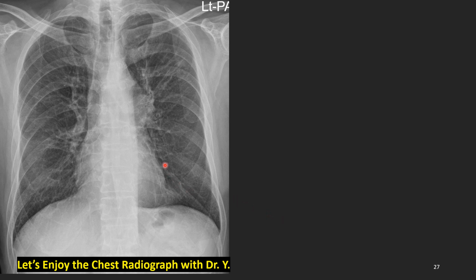We are all familiar with this patient, already having seen it many times. And actually this film is the highlight of this topic, session 19, missed lung cancer. This is the highlight, the climax image. Yes, this is a hilar tumor. Is it clear to you as a tumor?